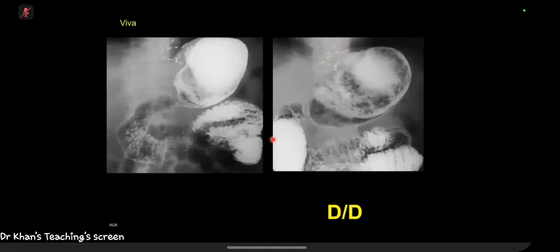Okay. There are surgical clips projected over the gastroesophageal junction. There is pooling of contrast in the first film on the left, which I think is an AP projection, supine, predominantly in the gastric fundus. The configuration of the stomach looks slightly unusual.